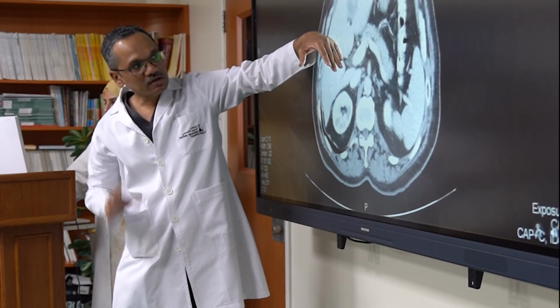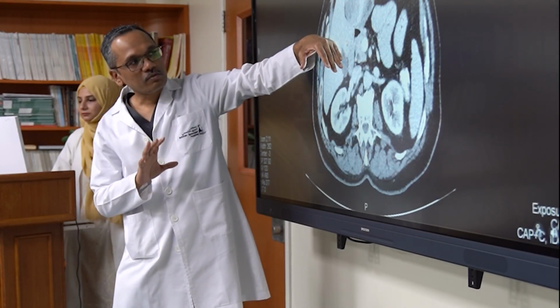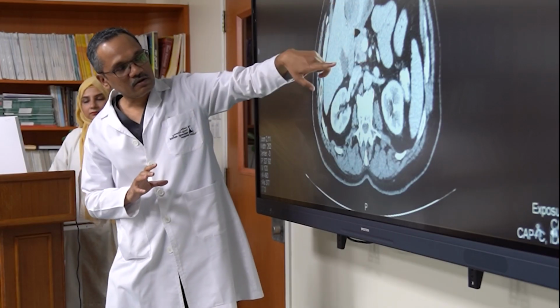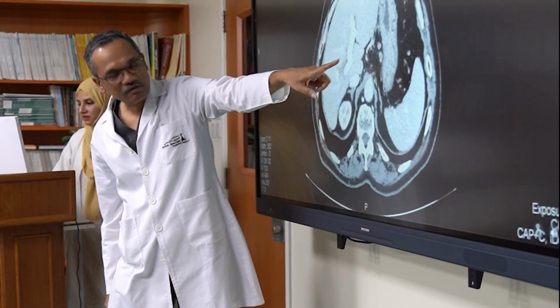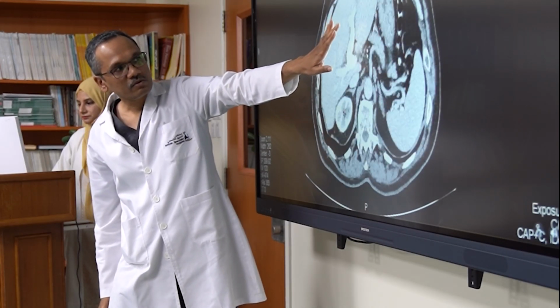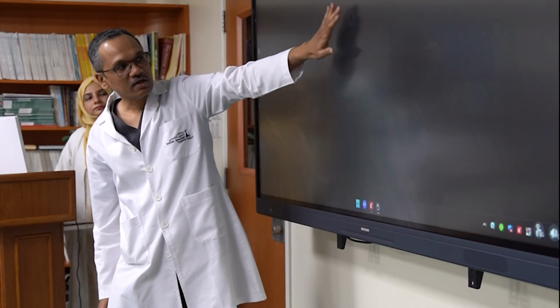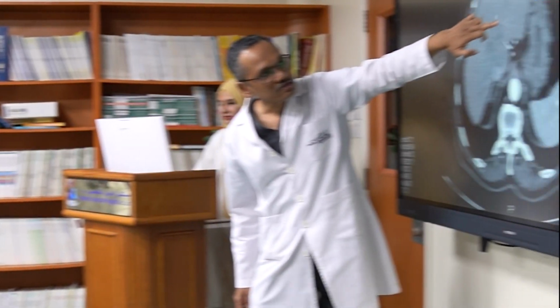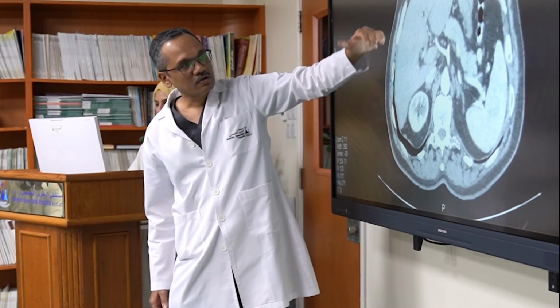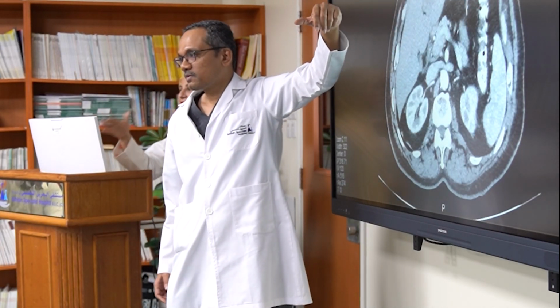So suppose we still contemplate liver resection instead of transplant in this patient, the ideal way to go about it is this: the lesion is not supplied by the main hepatic artery, it is getting an accessory hepatic artery from the left gastric. So we have to do transarterial chemoembolization, supraselective embolization of the left gastric, and at the same time go with portal vein embolization of the left portal vein. The problem is this is the arterial supply, coming from the left gastric, even after portal vein embolization, an aberrant supply also. Yeah, aberrant. So all the complications are there.